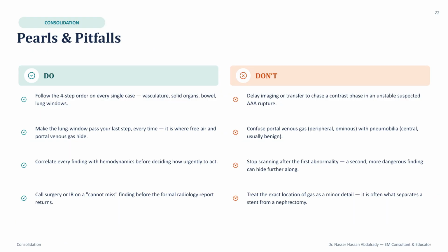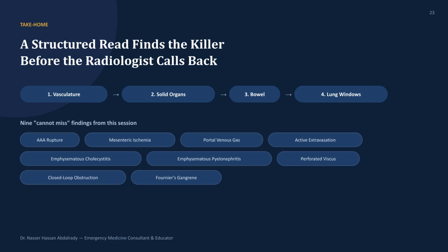Not every finding is a killer, but naming them correctly is essential. Recognizing common patterns like acute cholecystitis or an obstructed kidney speeds up diagnosis and helps you avoid unnecessary escalations. For cholecystitis, look for the tensile gallbladder fundus sign. For pyelonephritis or an obstructed kidney, look for the candy-striped nephrogram, where alternating bands of perfusion indicate localized inflammation or obstruction.